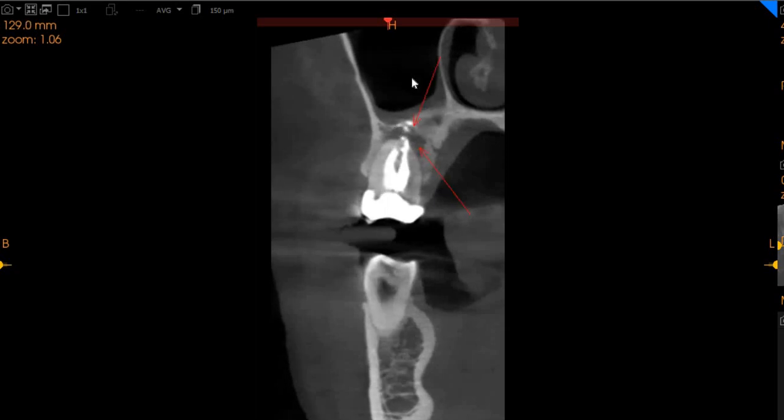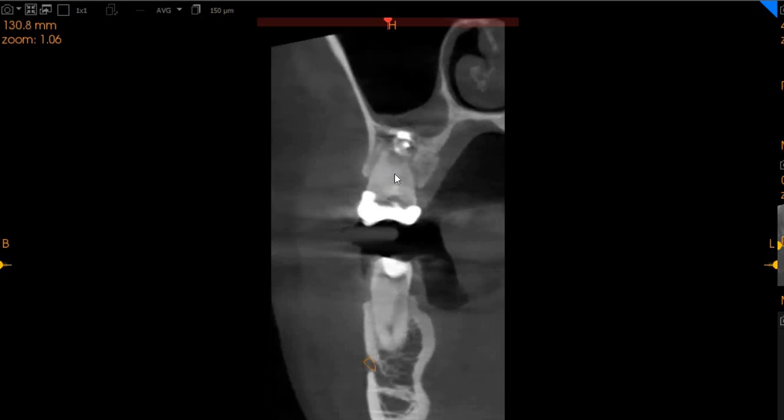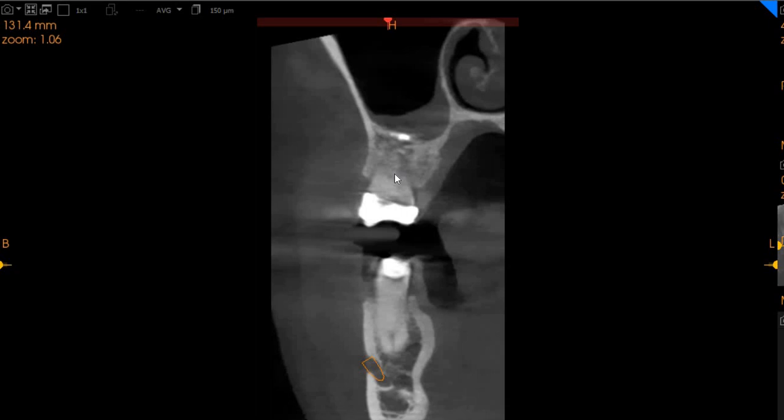All these materials are actually contributing to sinus issues as well. So our advice to the doctor would be to either do an apical surgery to remove all of this dental debris, or do an extraction, clean the sockets out, so that this entire radiolucent material and radio-opaque material can be removed from the bone and the bone can be given a chance to heal.